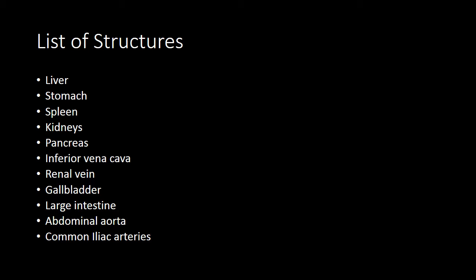Now, I won't be pointing out parts of the small intestines since it spans most of the abdomen and doesn't quite help as a landmark, but I will point out the location of the large intestine when applicable. I'll also be using a variety of cartoon images throughout the presentation to help orient ourselves, as well as show the orientation of some viscera in the abdomen with respect to each other.